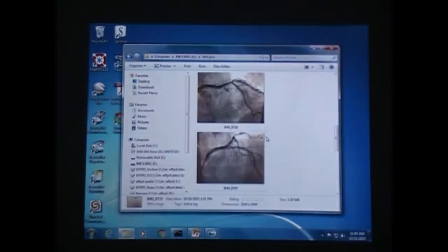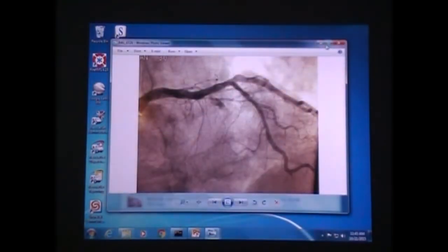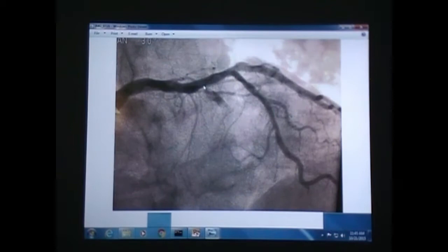When we took her to Cath Lab, okay, do you see this shadow? You guys can see my, yeah. See this shadowing right here? There should be a vessel right there. This is 100% LAD, coming down. So what we're looking at, I'll go to the next slide.